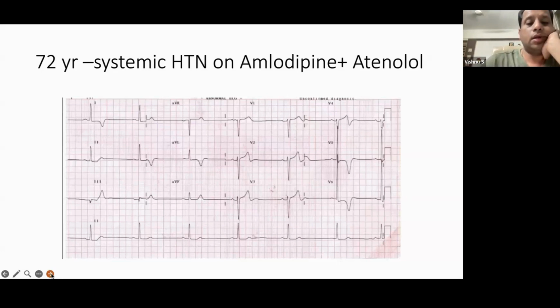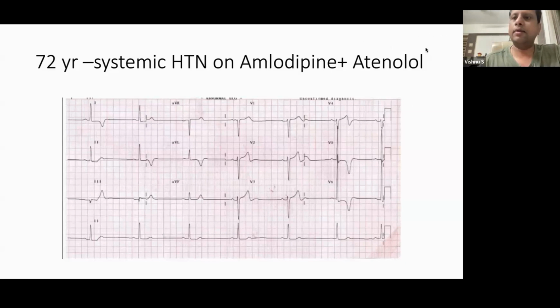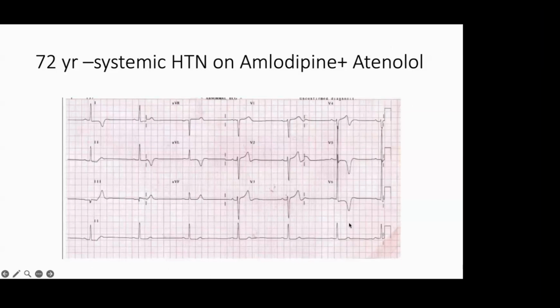This is a simple ECG. Can anyone tell the diagnosis? This is a normal, actually very easy one. Hello? Participants can unmute and answer.